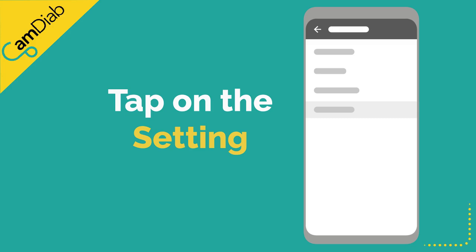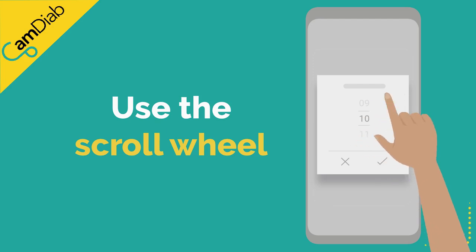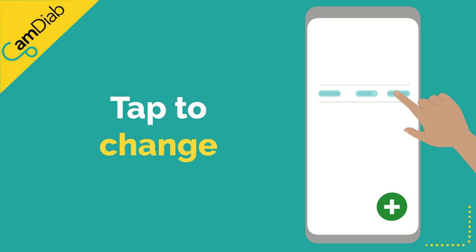You can enter or amend the bolus calculator settings by tapping on the specific setting and either use the scroll wheel to change the value for the minimum glucose, maximum bolus and duration of insulin action. Tap on the blue text to change the glucose target and insulin to carbohydrate ratio.